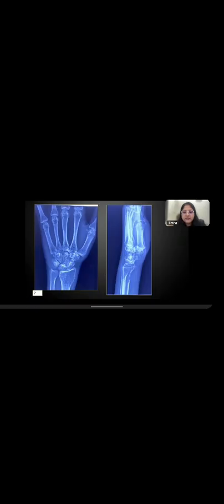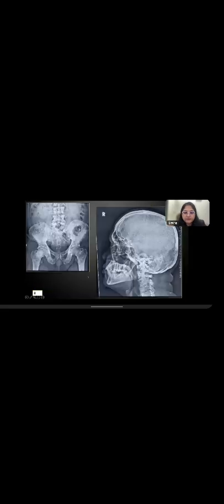Great. Dr. Ganesh has nailed it. There is a large expansile lesion in the epiphyseal region of a mature skeleton. Okay? Just look at the bones. They are fused. Epiphysis, metaphysis is fused. So now you will not think of chondroblastoma. Okay? So epiphyseal lesion in a mature skeleton with ballooning of the bone. There are thin septations within, no cortical destruction, no periosteal reaction, and it is a GCT.